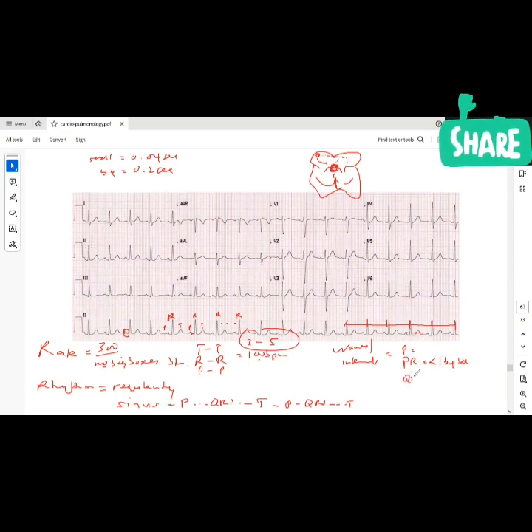Next, look at the QRS complex. The QRS complex is very what? About 3 small boxes in width, or less than that. That's about 0.12 seconds, right? So if the QRS complex is wider than 3 small boxes, that's a wide QRS complex. Of course, it can mean that there's something wrong with your bundle branches, right? The conduction apparatus of the ventricle. So that we see that.